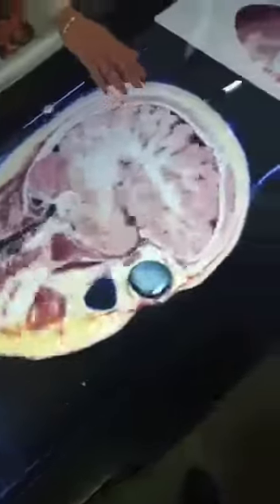So everything you see here is what we saw at 0.6 to 0.8 millimeter thickness. And so each time I turn around, slide through these sections, I can see where the lines on the actual cuts were done. And you're not just limited to the head and neck, you also have areas like the brain, large areas like the thorax and the abdomen, all the way down to the leg and foot.